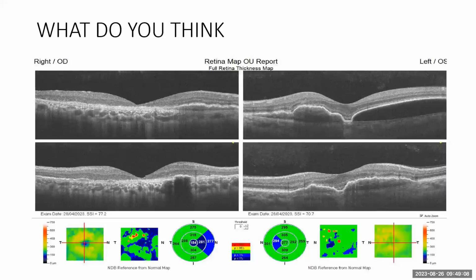Okay? So looking at this, you already have differentials in your mind, but one of the differentials that you will not entertain in this man is ARMD, because if you look at an eye that doesn't have drusen and does not represent an OCT, you put in your other differentials, other forms of pachychoroid diseases. You think about PCV. Is this PCV? Is this CSR? CSR would have been more on the center, central serous. This is not central, okay?